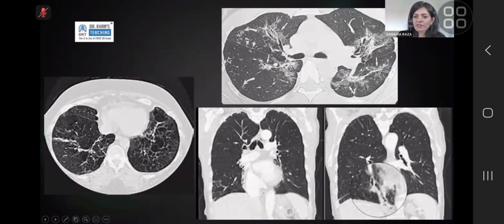This one, clearly linear atelectasis, so you want to call it chronic, but you have the surrounding ground glass opacification within it. Everywhere you see atelectasis, you have ground glass around it. So this is lung actively distorting itself, trying to heal itself while the active process is still going on. So this is probably subacute. This is active architectural distortion in a lung with active changes within it.